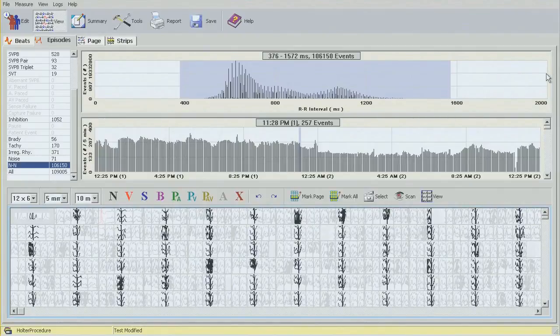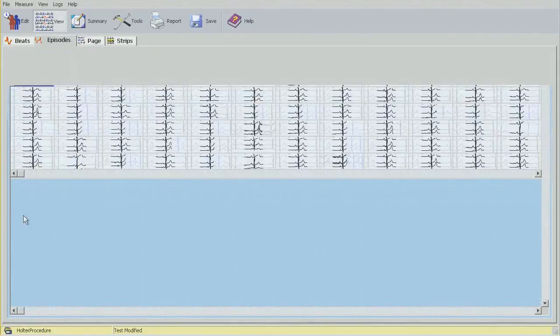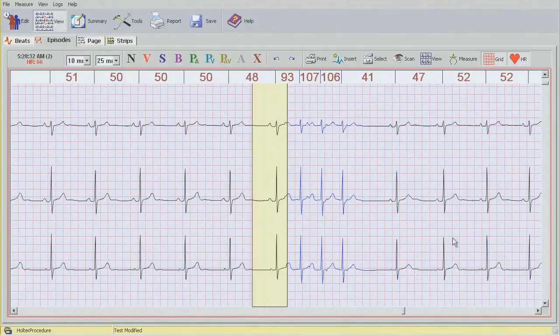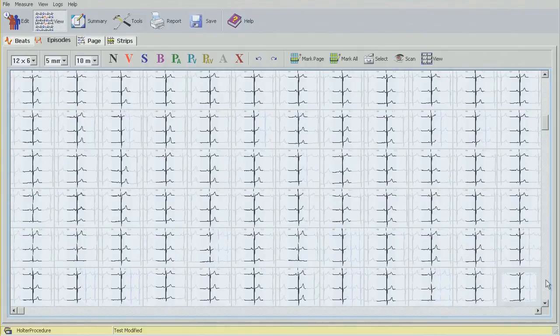What I need to do is hold the left mouse click down, and from as far to the right as I can, drag it over. And I usually like to look at about 1,000 events or so. So once I pull them all up, again using the Z button on your keyboard, I'm just going to scroll down. Before I do that, there's a missed couplet, I believe, which I want to change. It's a triplet. And go back and look at the rest of those.